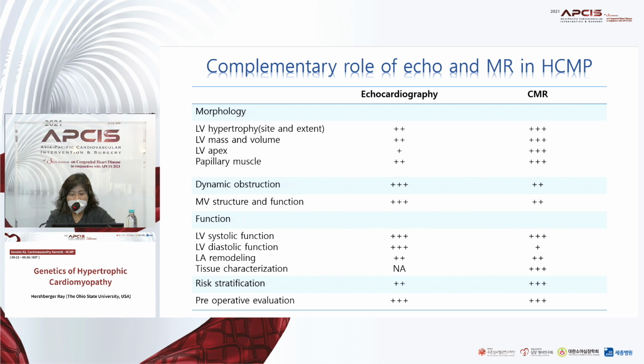And tissue characterization, one of the most important parts of HCMP, is better evaluated with CMR.